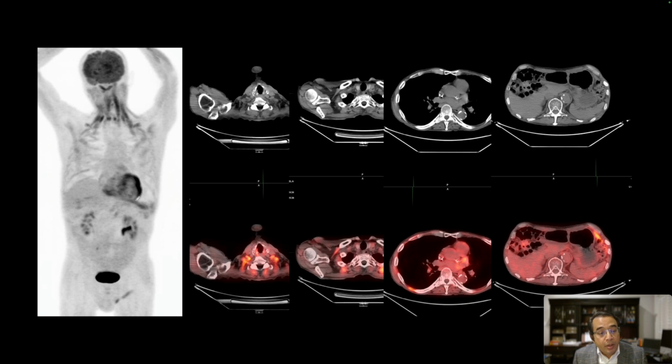Their left ventricle is dilated, and there is increased uptake in the left ventricular myocardium as well. And these fused images are showing uptake in the sternocleidomastoid and scalene muscles, trapezius and pectoral muscles, and also posterior intercostal muscles, and uptake in the diaphragm.